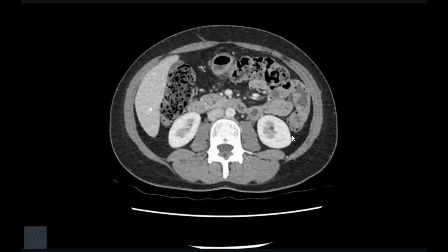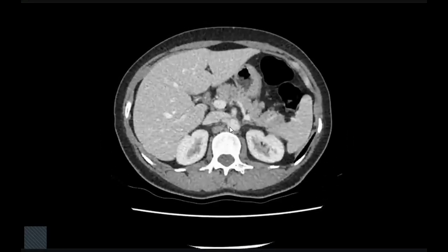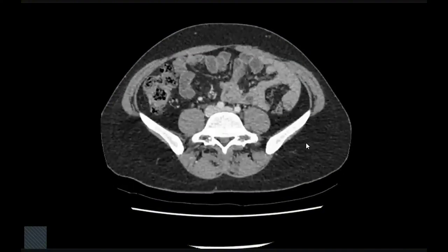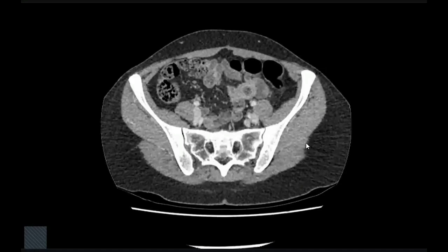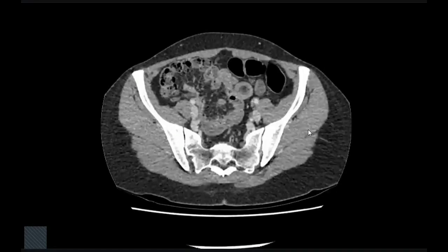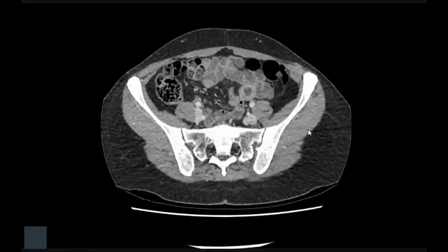So I'm looking, okay, look, the liver is good. No, I will ignore it, go to the bowel. If he told you to go to the bowel, he will cut from you at least 2 marks from 4 in observation. If you go for the bowel and you scroll and you didn't detect the abnormality, he will cut the next two. So he will cut the 4 marks for observation.